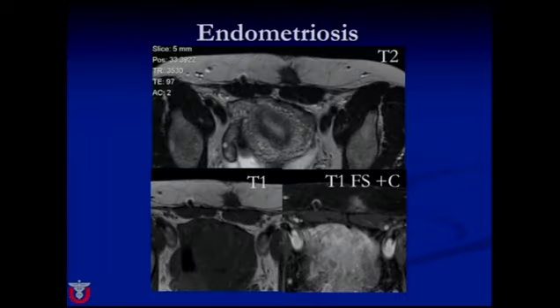She also had an MRI of the abdominal wall because that's often how the surgeons evaluate the extent of soft tissue sarcomas. And you'll see that this is a very irregular, quite nasty appearance. On the T2, it's distorting the surrounding fat. On T1, it's not high signal. After the contrast administration, there is some enhancement in the area. And when we use MR for an endometrioma in the ovary, it's very helpful because we can see high signal from the blood products. But in endometriotic implants, the primary thing that's going on is a soft tissue fibrotic reaction, and we don't always see that.